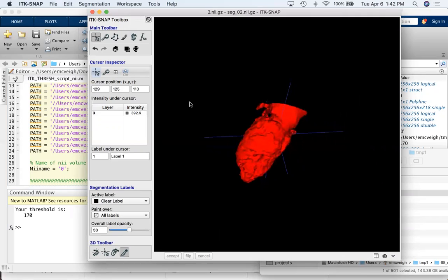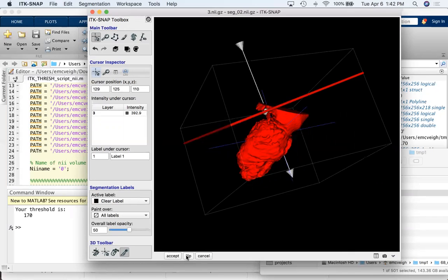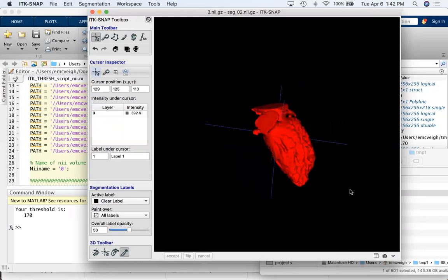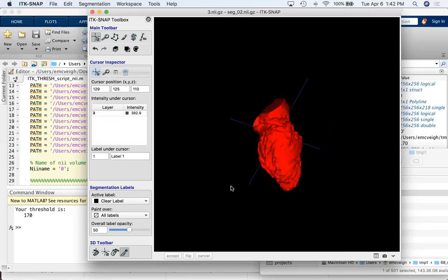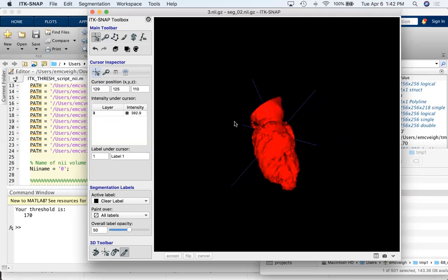And what is that? Oh, look at that thing. Ah, let's cut that off. Okay. Just cut that off. And there's a vessel there. See, that is a coronary or a lesion or something. It's snuck out into there. Dang. So this is where, if you want to cut, that's a hard thing to cut off, right? Because it's inside this thing.